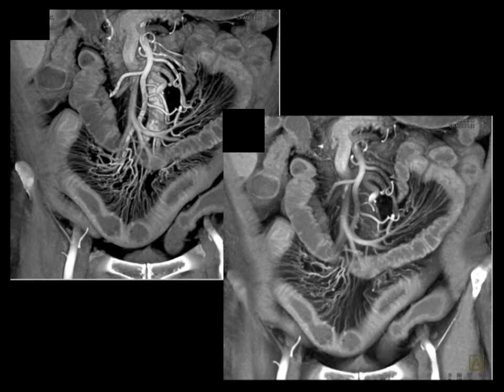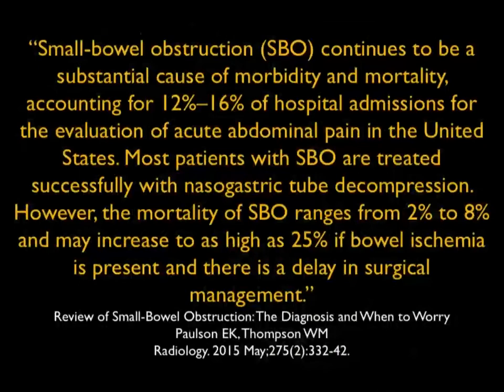So now you see the thickened bowel. You see evidence of minimal bowel dilatation. You see the comb sign, very prominent vessels in a patient with active bowel disease. Now from there, we know what bowel looks like, and so we want to look at bowel obstruction.